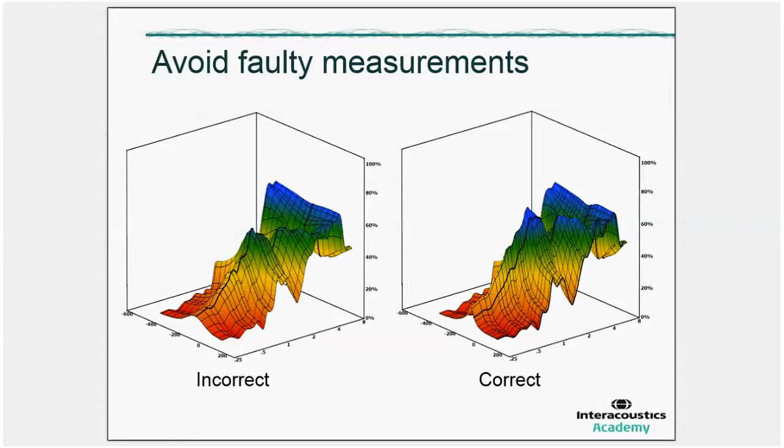In research, this means do not use the stop button, because you will corrupt the measurement. This is just to avoid extra work and confusion afterwards, but we can recognize if the data was corrupted or not. So our Excel program will automatically ignore corrupted files.